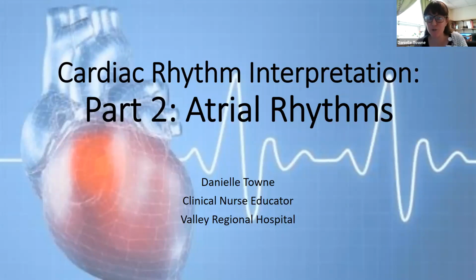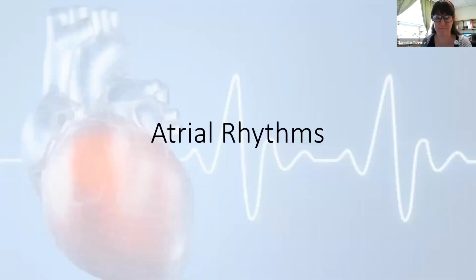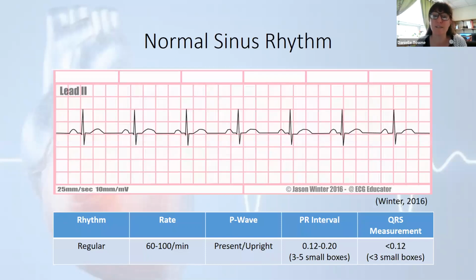Hey guys, all right, so we're going to do part 2 of the cardiac rhythm interpretation course, atrial rhythms. So let's just jump right into it. Our first one we're going to talk about, normal sinus rhythm.